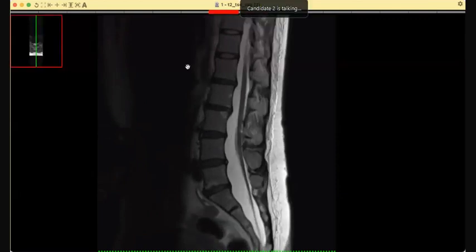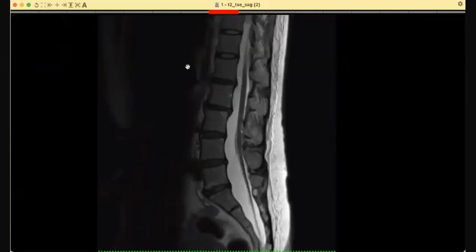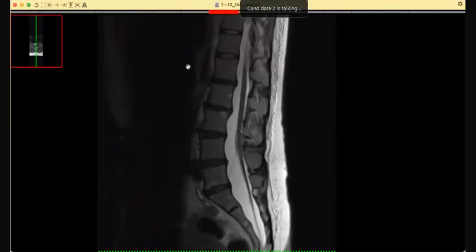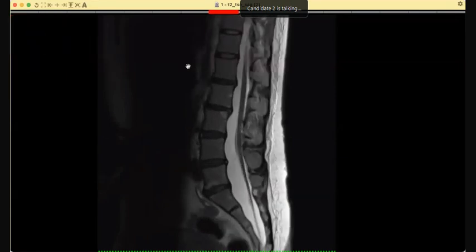The lower spinal cord is plastered posteriorly to the posterior spinal elements, making it less flexible, and which can be the cause of the neurological symptoms like urinary bladder incontinence. Sorry, I couldn't hear you earlier. I couldn't hear the history because of network.